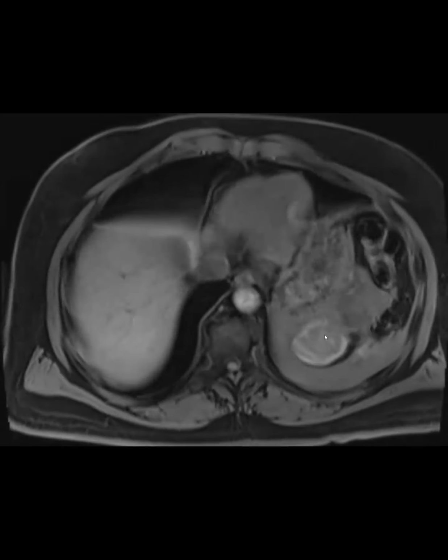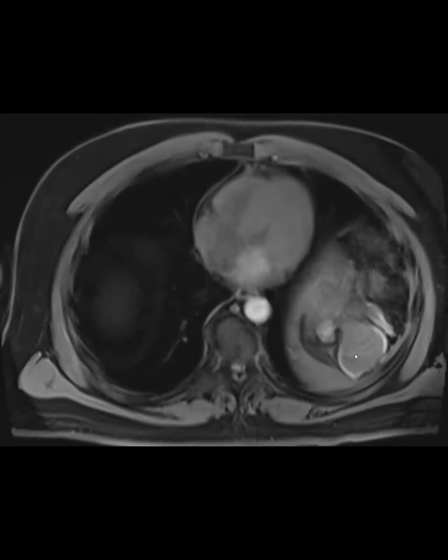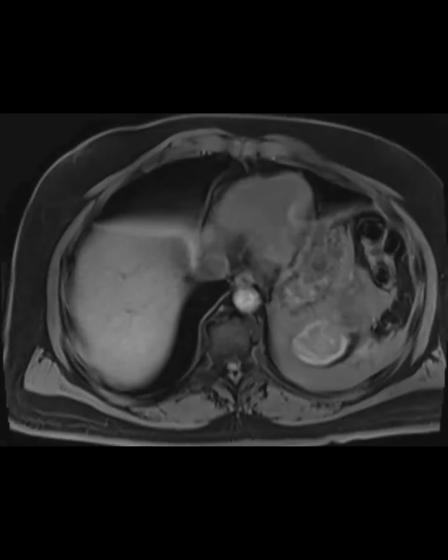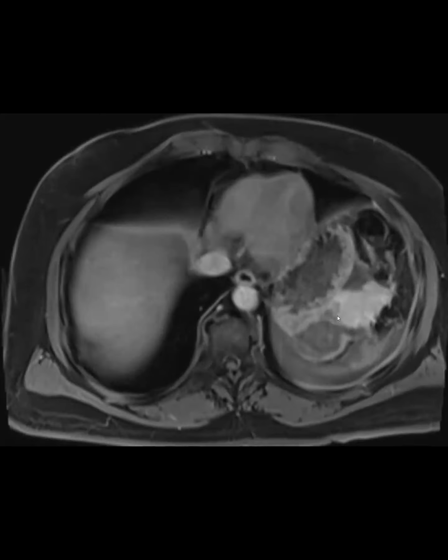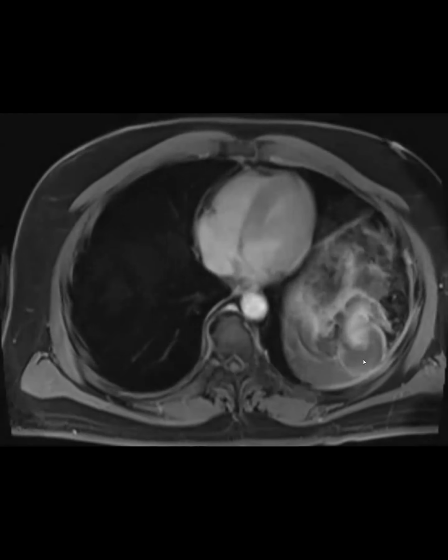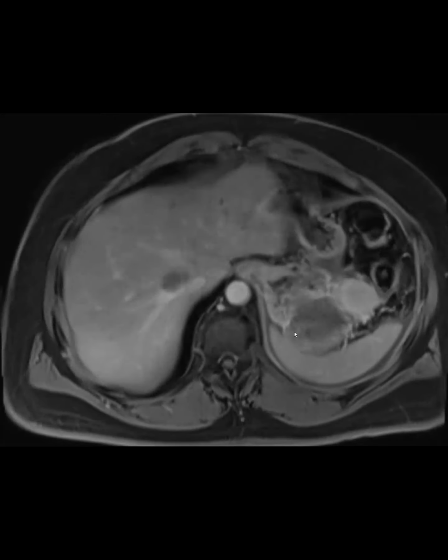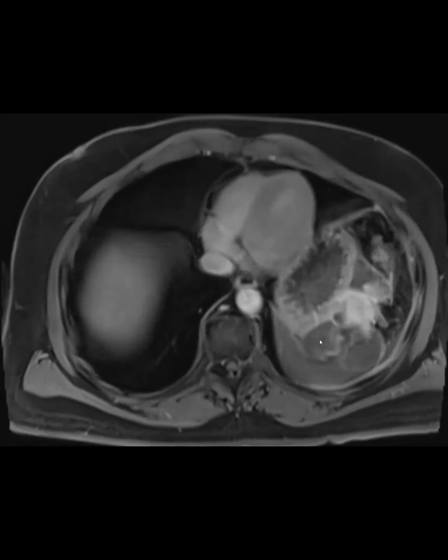You can see that the parts that we thought were blood have T1 hyperintensity with that peripheral rim. So definitely hematomas. And then this was the dense part. Then I'll go to the delayed, and you can see that that dense part is densely enhancing, and it does have this interface with the stomach. So again, it looks like a weird shape, but the only thing we could think of for an exophytic gastric mass that's bleeding is a GIST. And this was resected and was a GIST. So it was a rare ruptured hemorrhagic GIST.